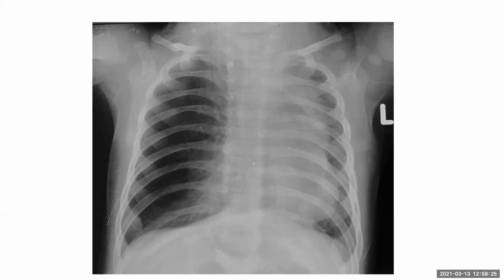Okay, let's come to the lungs. This is a chest session going on, not a bone session. Let's come to the lungs.